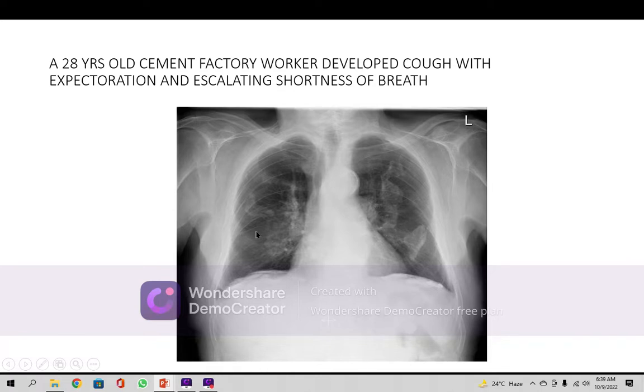And what is called the interstitial group of lung diseases, yes, it is. And what is caused is pneumoconiosis, because he is a factory worker. Pneumoconiosis can cause these fibrous bands, sac-like, and these are called plaques. Pleural plaques are there. And there is only one condition in which it occurs, and that is asbestosis. It can cause this type of picture, not the other pneumoconioses. This is the differential diagnosis first, and the final one is asbestosis, most likely.